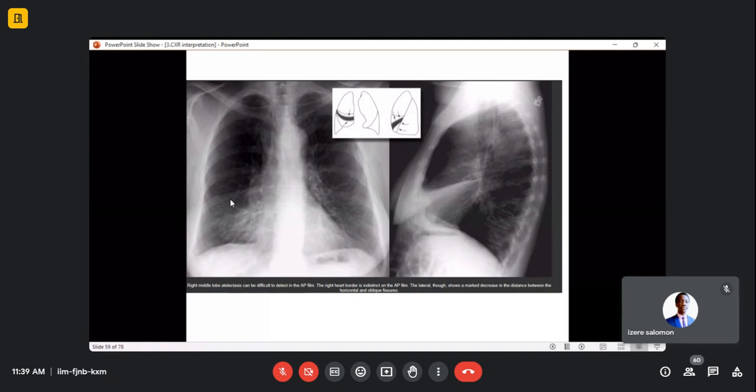Be systematic. Start with the mediastinum, even if there is an opacity. Is it okay in size? The 4 S's: size, shape, shadow, and site. Check the size, check everything. The trachea, is it central? No. If you started with technical qualities, you know it may be due to rotation. Then you go to the vessels: is there any pathology of the great vessels? I don't see any. The heart size is okay.